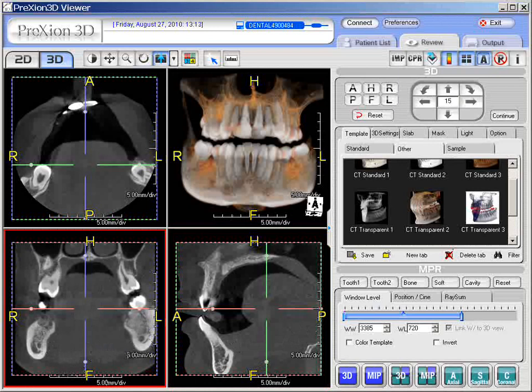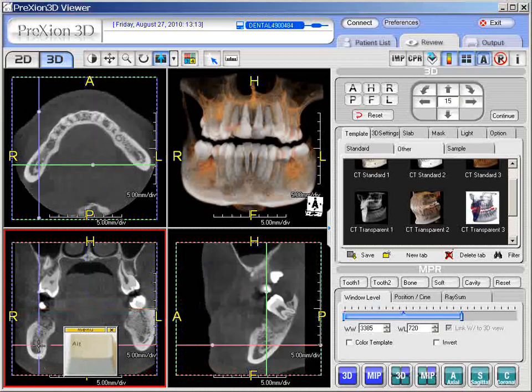At this point, we can bring in the Alt key. Hold it on the keyboard right next to your spacebar. Once you've got the Alt key selected, you can hold it down. You're going to see a little caliper. This apparently is the mandibular canal on the right side. So I'm going to just left click it into position, and then we can release the Alt key.